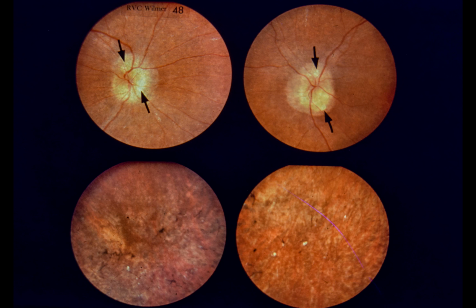The prevalence of optic disc drusen in patients with retinitis pigmentosa is higher than that in the normal population. Progressive visual field loss and night blindness in a patient with optic disc drusen should alert the physician to the possibility of concurrent retinitis pigmentosa. An electroretinogram will establish the diagnosis. We now leave the elevated disc anomalies that simulate optic disc edema and consider other types of anomalous optic discs.